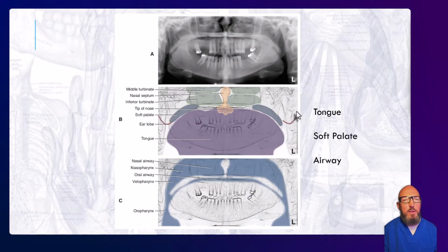All right, what about soft tissue structures? Do we need to be aware of soft tissue structures in pano? Absolutely. And what is this large purple thing if you compare with the actual panoramic radiograph up here? Is that really the tongue looking that huge? Yeah. The tongue sits on the point of rotation for a long time during the scan, so it gets horizontally stretched. It looks ginormous. Between the tongue and the soft palate or the hard palate will be an airspace, so the palato-glossal airspace.